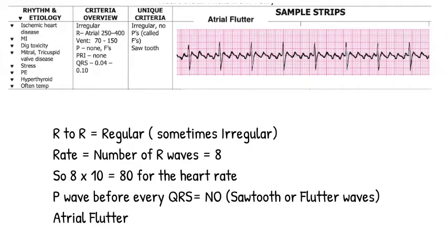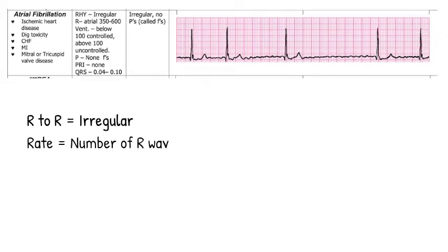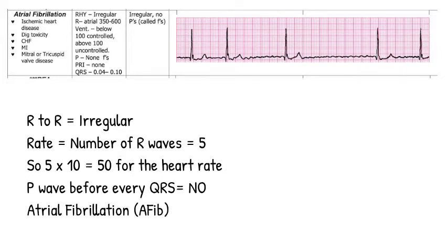I see in front of the QRS complex with the second rhythm there, the second R complex, there might be a P wave there, but it is not consistent with the findings of the other QRS complexes. They do not have a P wave in front of them. So this is where the atria is kind of chaotically firing. It's not being consistent. It's just kind of quivering, you might as well say, there and not forming a complex, the P wave. So there's no P wave present.